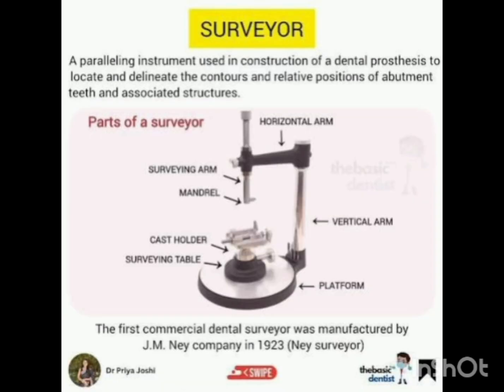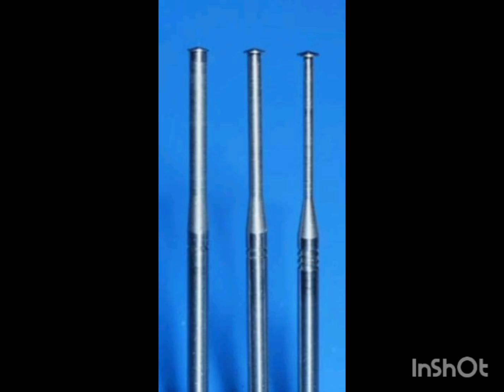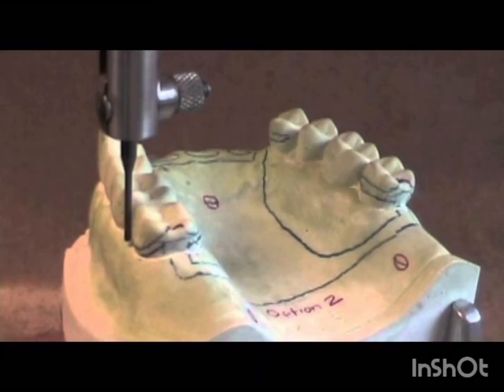To summarize, the prosthodontic surveyor is an essential instrument enabling partial denture design. It helps determine the path of insertion, locate undercuts, identify guide planes, and improve overall prosthesis success.